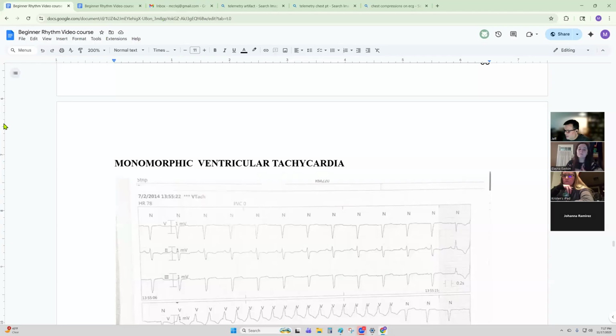So the sinus stuff, you get your normal sinus, brady, tachy, arrhythmia. But outside of that, you have sinus pause, sinus arrest, and asystole. So for Philips, which I think everybody here will use, per the machine's definition, it's a gap of time, because the Philips machine is constantly measuring every R to R. It's saying, okay, this is what it usually looks like, and it kind of tracks that.